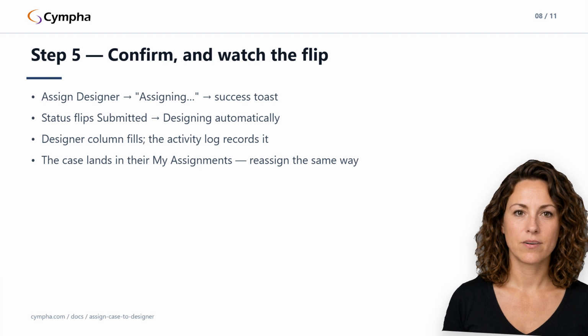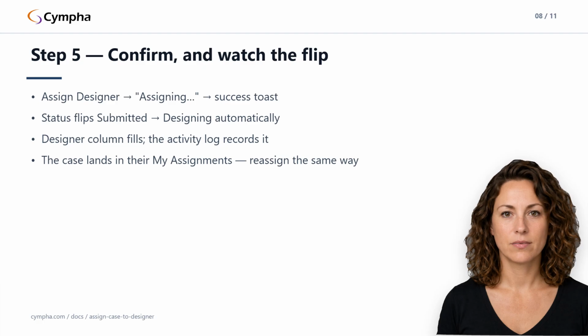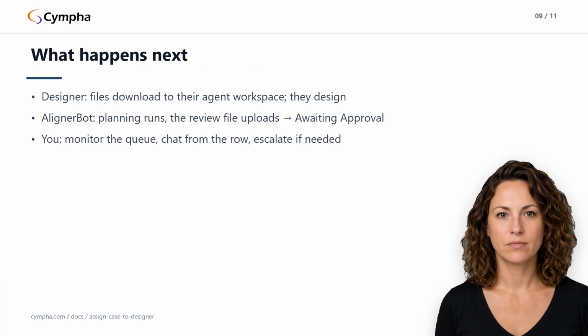From the moment the toast fires, 3 parallel stories. The designer sees the new case in their assignments. If they've paired the Cympha Agent Manager and configured a cloud monitoring workspace folder, the case files download to that folder on their machine, and they open the case in OrthoPlus, Implant Master, OrthoClick, or Studio. The designer's first day lecture covers that whole side of the handoff.